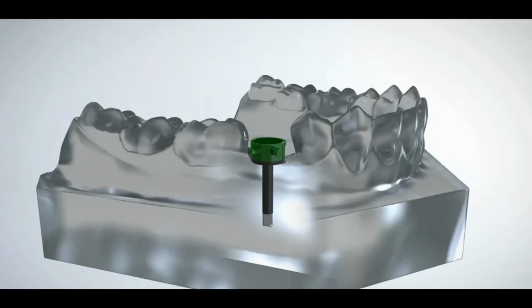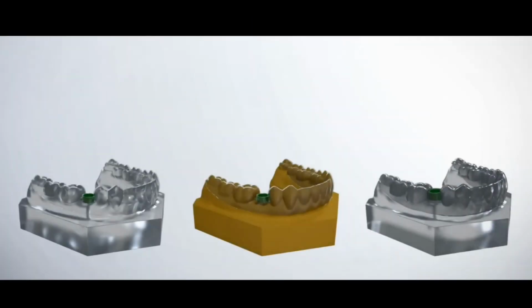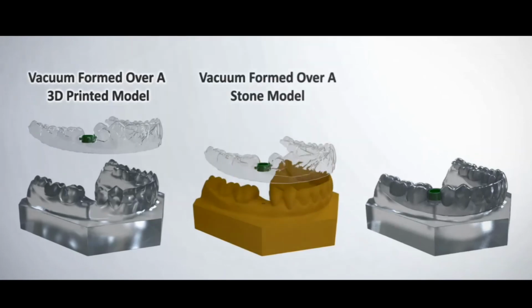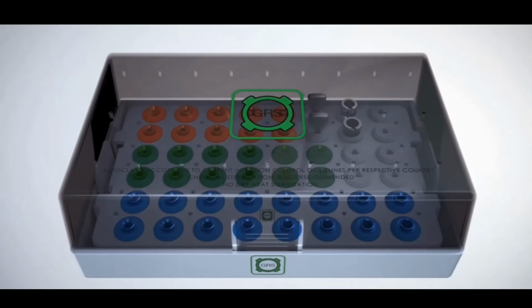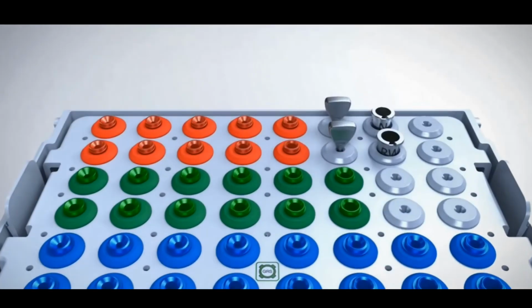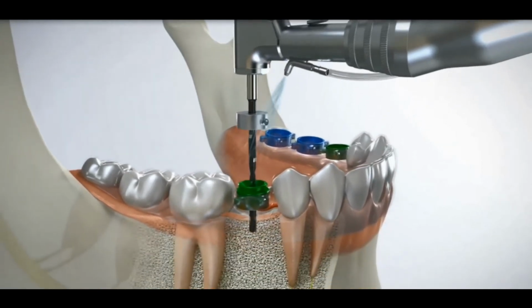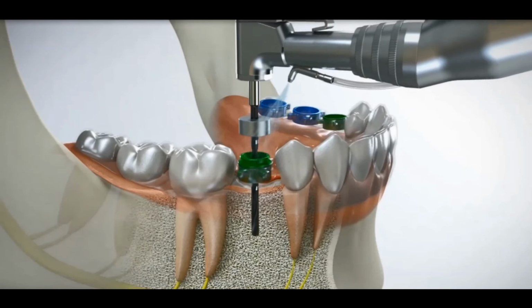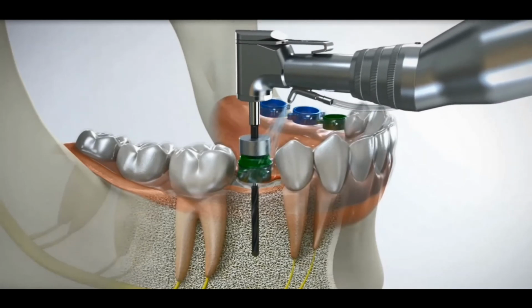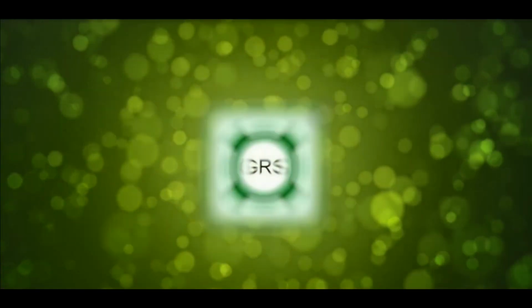Once the model has been printed, simply use a GRS vacuforming assembly consisting of a locator pin, surgical ring, and protection cap to create the most accurate and form-fitting vacuform surgical guides available today. Other videos describing the complete GRS guide system and surgical components, guide fabrication techniques and applications, along with a virtual surgical procedure outlining the seamless step-by-step surgical sequence when using the GRS guide system can be found at grsguidesystem.com. The GRS model is now ready to be printed either in office, by your lab, or simply through GRSGuidesystem.com.